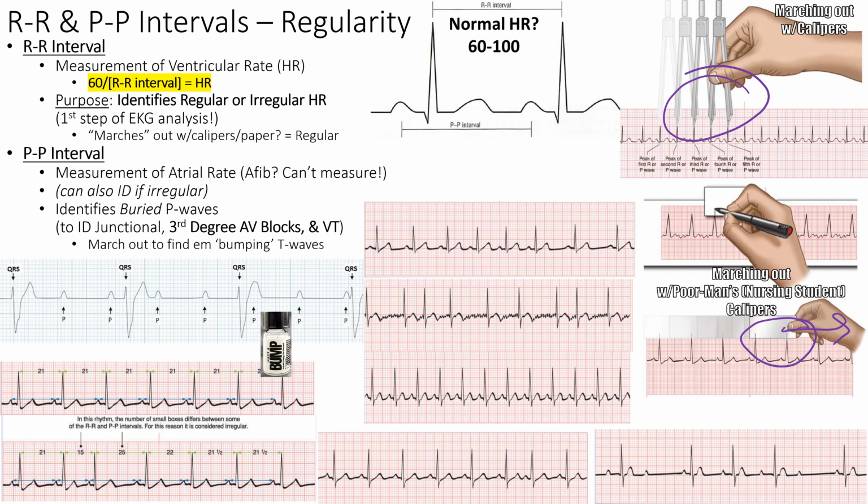So one of the ways we can see if someone has an irregular rhythm is that fashion, but also there's what's known as AV dissociation, where the atria are doing their own thing compared to the ventricles. The ventricles are contracting to the beat of their own drum, literally, and the atria are doing their own thing. They are literally divorced, right? Like when you have ventricular tachycardia, your ventricles have taken over and are tacking away ventricular style, which is wide QRS complex style, and you can even find some P waves hidden in there, doing their own thing. That's called AV dissociation.